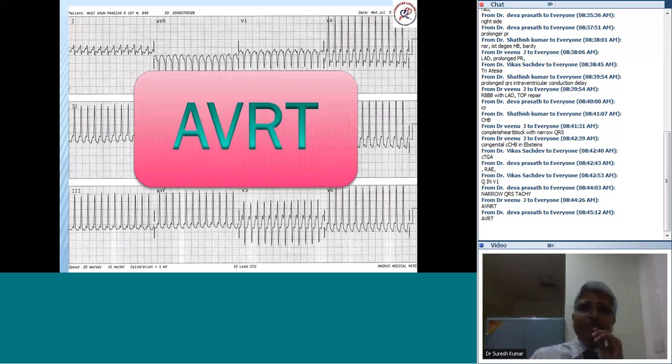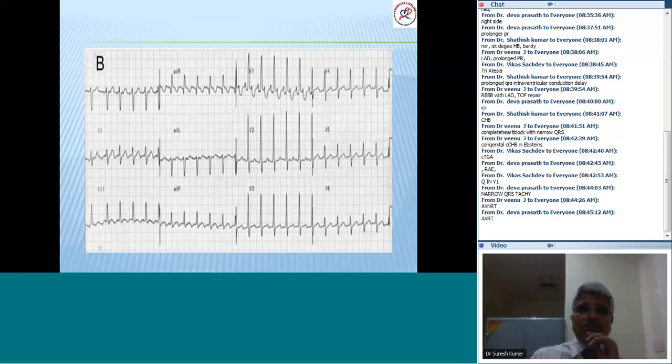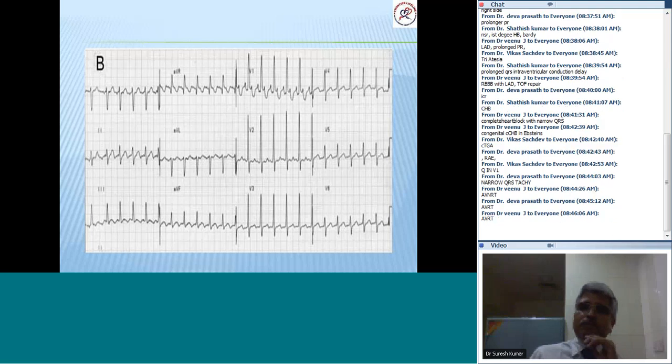This is a different ECG. Anybody? Good, we know you are on the right track. Anybody else?